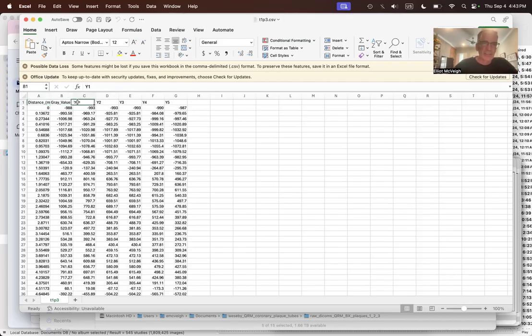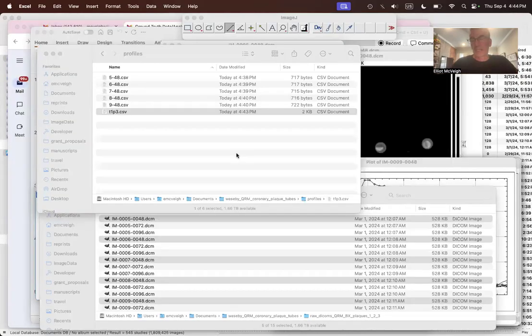So you probably want to change these labels up here to 70, 80, 100, 120, 140. Does that make sense? I have 70, 80, 100, 120, 140. I don't know why I have an extra one. Is there a good reason why I have an extra one? Not quite sure how I got an extra one in there, but you can figure it out. Okay, so that's quickly how I would do those plots. All right.